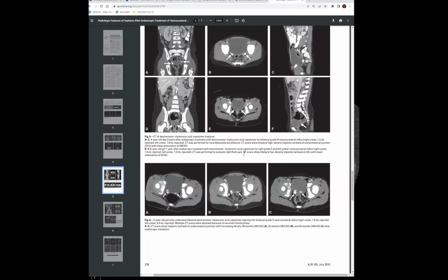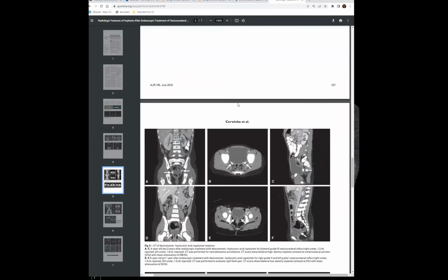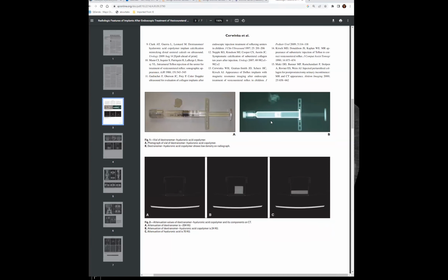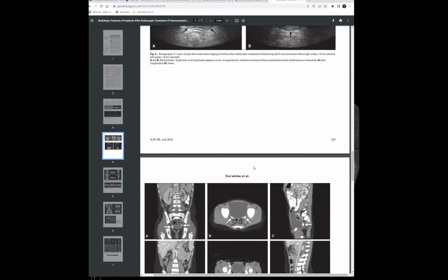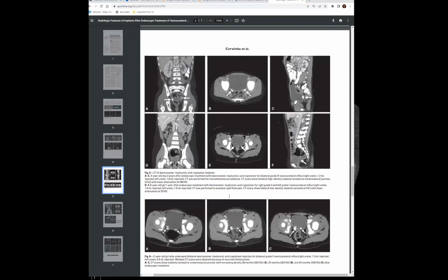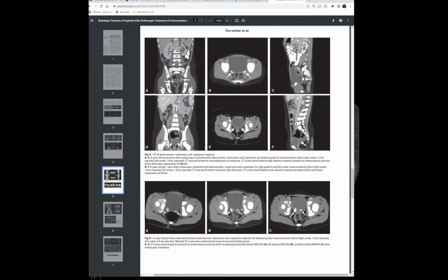I think maybe it's the material. Maybe over time it has more density, but on radiograph it has this low density, so it's not super dense like calcium. What I suspect is that immediately after injection it's low density, and over time the body does its thing and it becomes more dense. It says the low density one is 1 year later, and the high density one is 3 years later, in the captions there. Gotcha. So it seems like it gets denser over time.